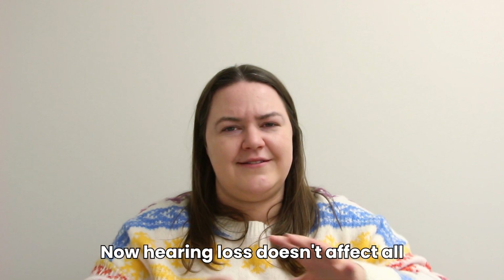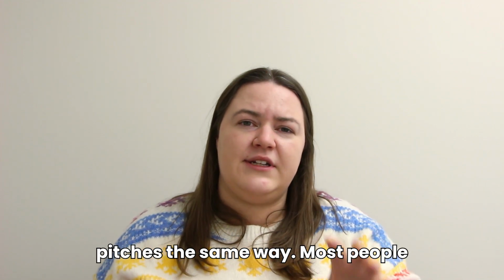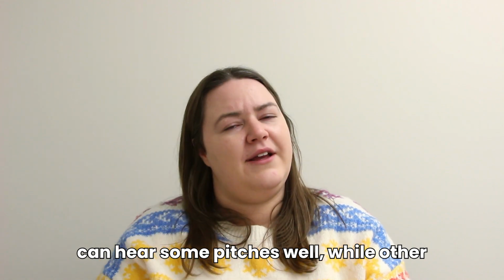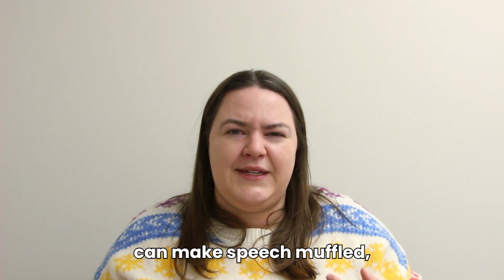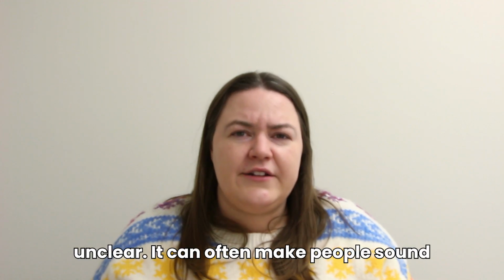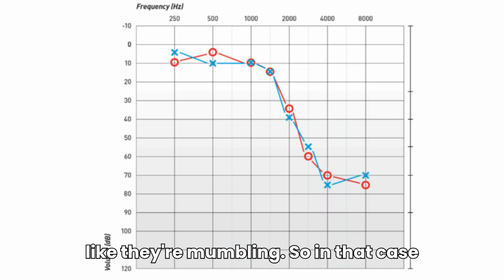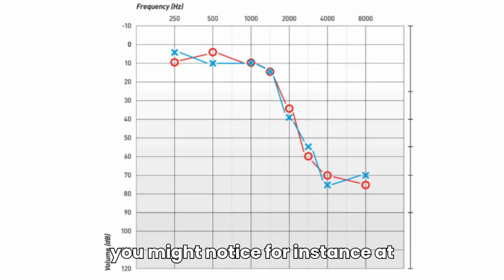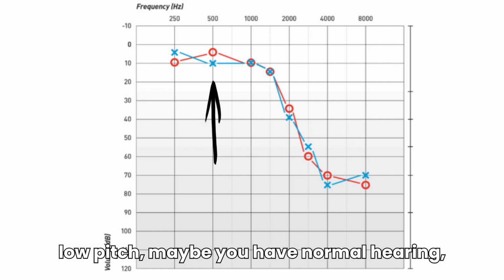Now, hearing loss doesn't affect all pitches the same way. Most people can hear some pitches well, while other ones they're not hearing as well. That can make speech muffled, unclear. It can often make people sound like they're mumbling. So in that case, you might notice, for instance, at 500 hertz, so for that low pitch, maybe you have normal hearing.